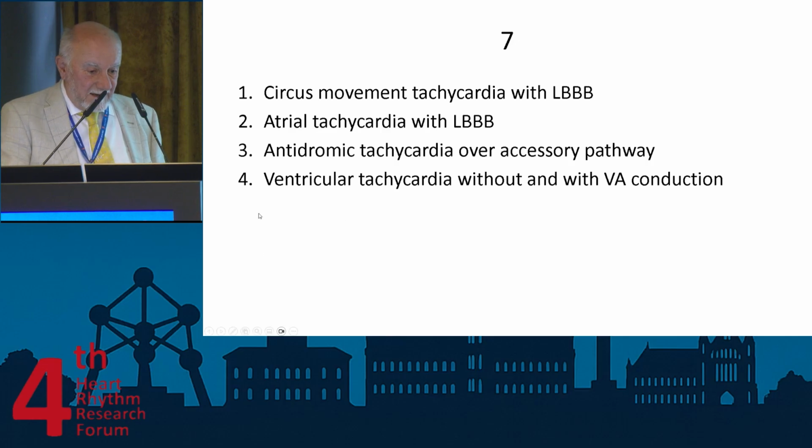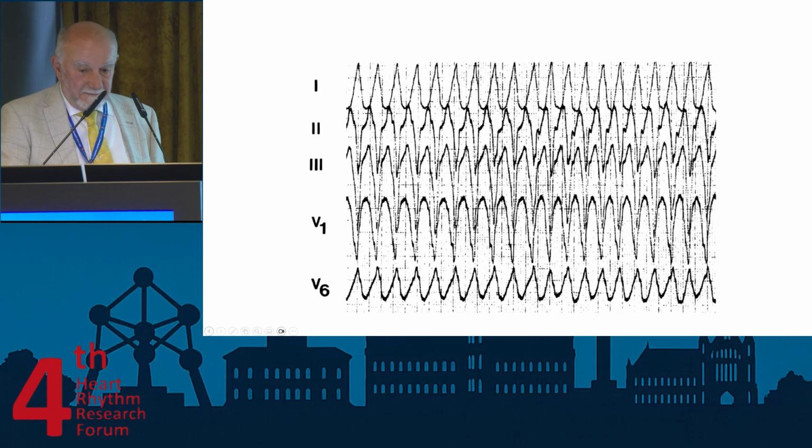You see the tracing again? Voila, left bundle branch block, left axis, and it accelerates suddenly.